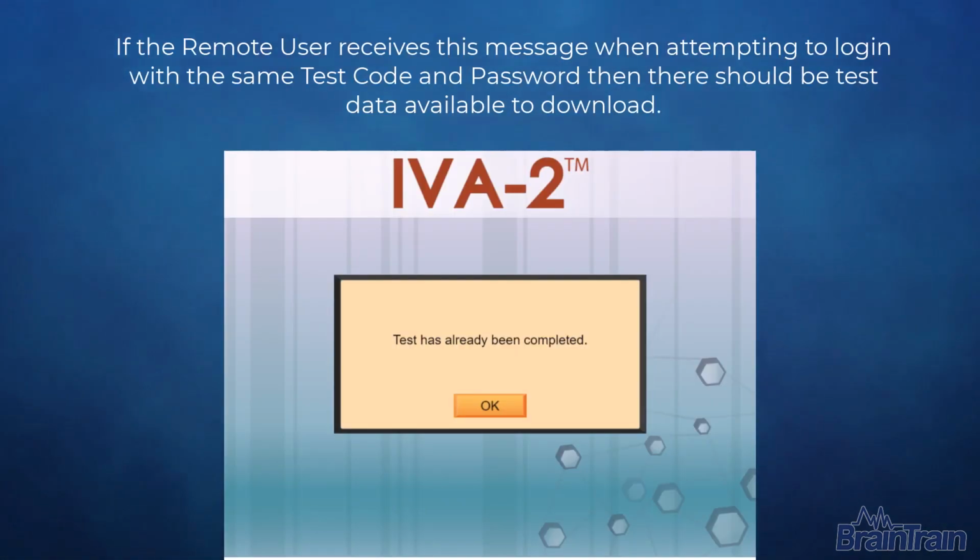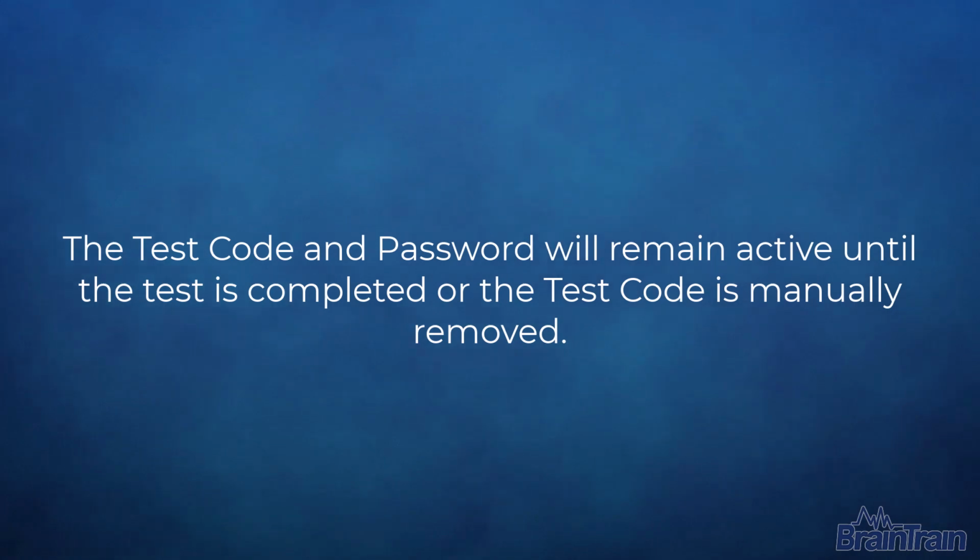If the remote user receives this message when attempting to log in with the same test code and password, then there should be test data available to download. The test code and password will remain active until the test is completed, or the test code is manually removed.